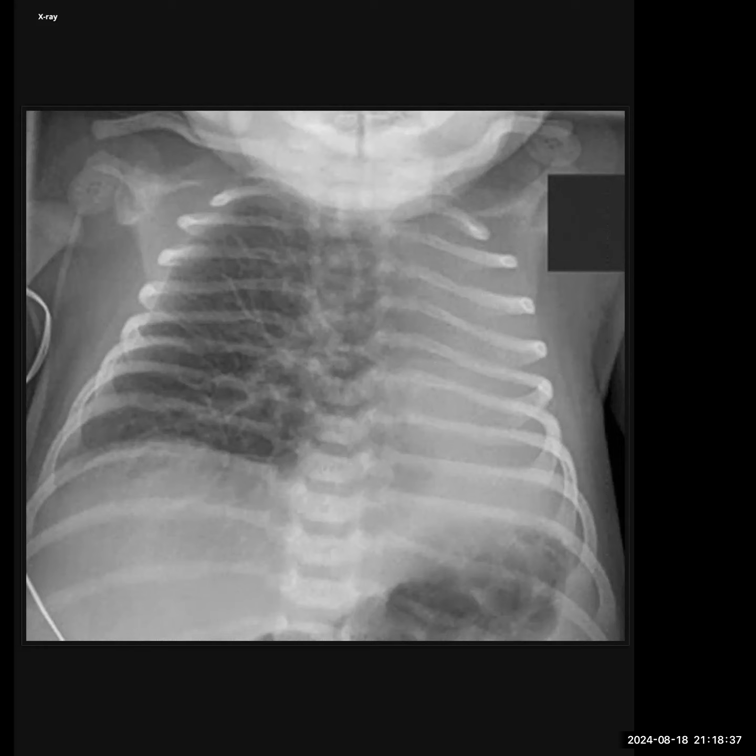I'm trying to trace the trachea. I can't quite trace the trachea to look at mediastinal shift. I think this could be left mediastinal shift. Other than that, I'm trying to assess the cause of this opacity. In a neonate, I'd be thinking in terms of pulmonary hypoplasia, aplasia. That would explain this finding. Or bronchial atresia on the left side. That would explain these findings.